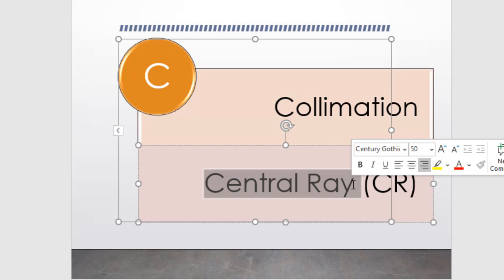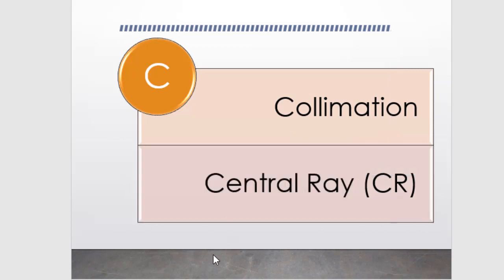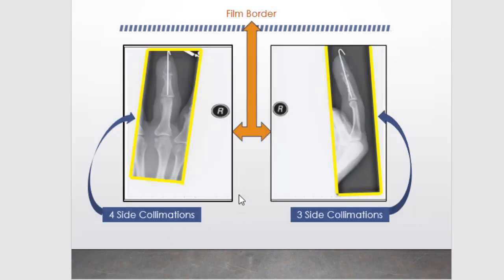When you position the patient, you are centering the CR, correct? Not the cross. That cross will intersect one anatomy, and that is called the central ray. By looking at the radiograph, you can identify where the CR placement was done when the patient did certain projections. By using a certain technique, we will check on that.